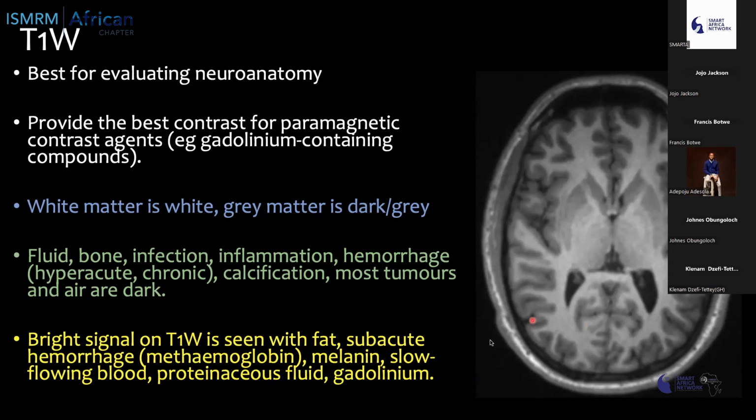How are we able to tell on the brain if the imaging is T1 or not? So the white matter appears white, that's the areas around the ventricles. They appear white, and the cortex, which is the gray matter, they appear gray. Okay, so there's a popular saying on T1, white is white and gray is gray. Simple, so that you can follow and be able to pick it up. There again, if you can see here, the ventricles, which contains the CSF, is dark.